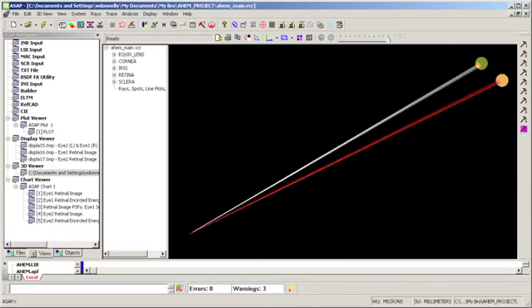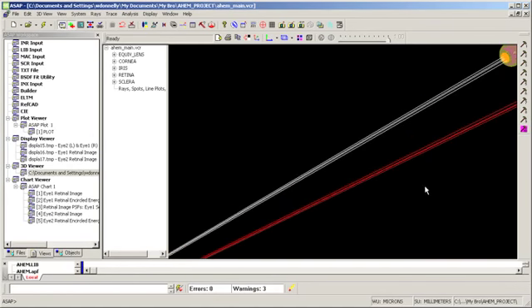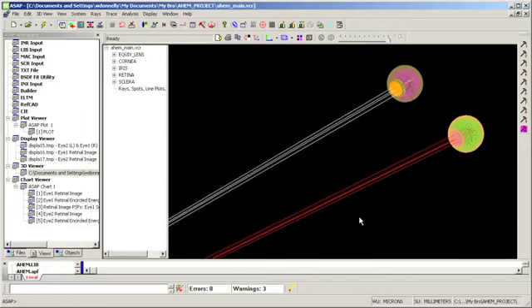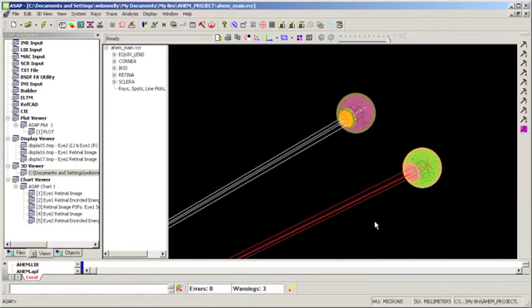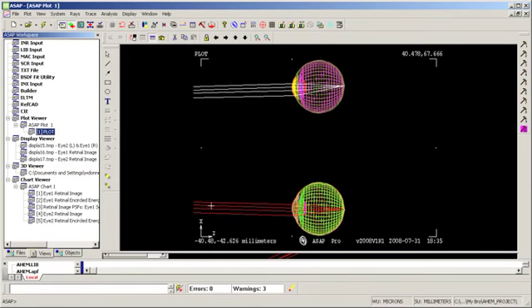Here we use the eye model to simulate 2 eyes. In this graphic, we have 2 eyes looking at a target at 1 meter, and they have some vergence or rotation to the eyes while they look at this point. So let's kind of zoom in there a little bit. You see we have rays from that source target going into both eyes. There's another graphic, or a top view.